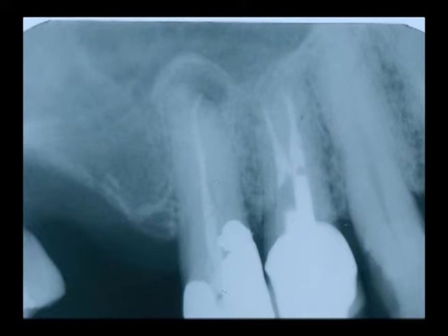The reason for this is that there is no bone to be insulted per se by the apical infection. It is very close to the floor of the sinus, and the periosteum of the floor of the sinus is the reactive area. Here we see an example of a periostitis, halo shadow over a root canal treated tooth.